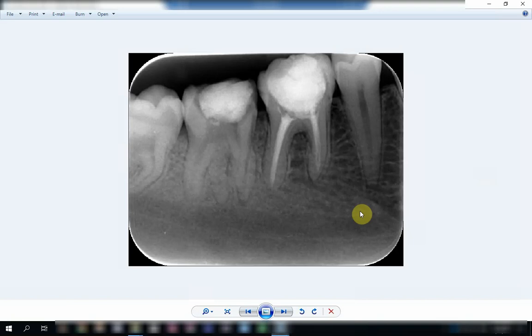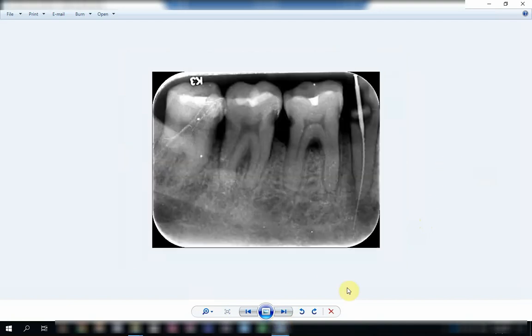incomplete apex earlier. We said that an incomplete apex, especially in a growing tooth, always takes the funnel shape. It will never assume the rounded shape. It is always funnel shape until there is complete growth or closure of the apex of the tooth, and of course here we must know the age of the patient. Okay, let's go to another case.